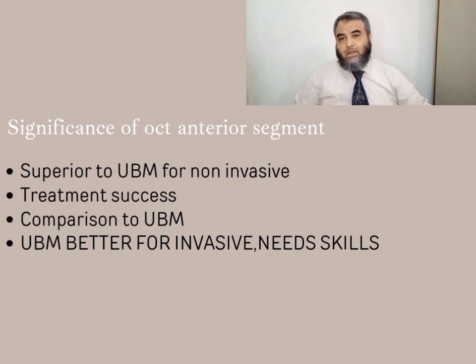It tells you about the different layers and where the epithelium is changing, but it has certain limitations: if there is optical shadowing or extensive fibrosis, it cannot very clearly show us the posterior margins of the lesion.